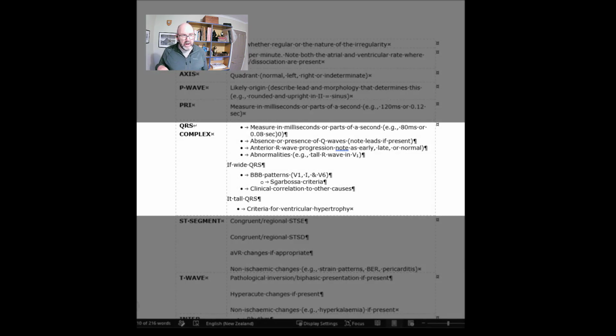The sixth area on the template relates to the QRS complex. A major amount of work occurs in this part. So it requires significant attention to the duration of the QRS, because this will determine which process is used to isolate the pertinent data that you need and what can be analysed from this. Crucially, the duration also determines whether the analysis of the ST segment can be achieved using the normal ST segment criteria. So let's have a closer look at this.